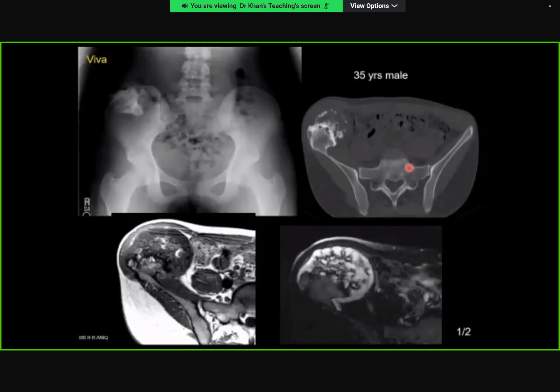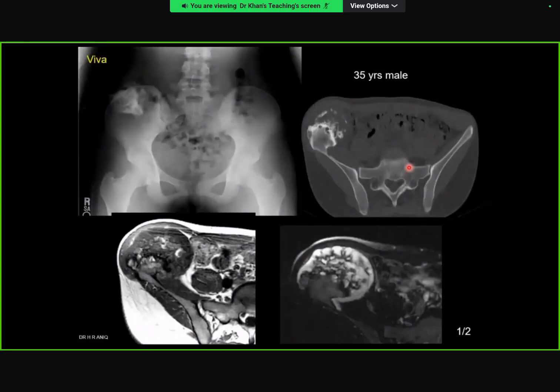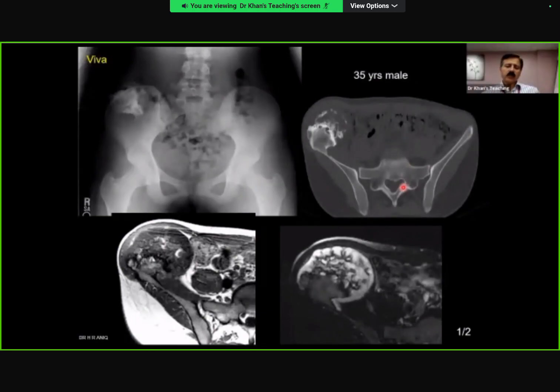The lesion appears to be irregular. On the CT, the lesion appears to be pedunculated with more lucent areas anteriorly. On the T1 and STIR images, I can see a cartilage cap which is enlarged and concerning for a malignant transformation. Excellent. Well done.